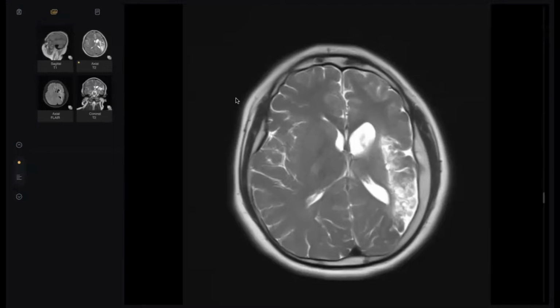When I see multiple enhancing vessels on the post-contrast images, and I see cortical calcification. Where is the exact location of Sturge-Weber syndrome enhancement? Leptomeningeal angiomatosis. Sorry, angiomatosis, not angiogenesis. What is the alternative name of Sturge-Weber syndrome?